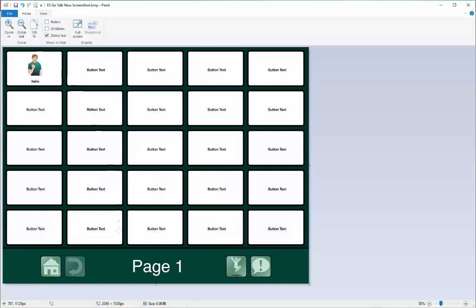I'm going to zoom out just so I'm sure I'm in the right place. So this is where we'd like to put our bump, right in the center of that. And that looks to be around 817. Well, when I measured earlier, it was 817 and 1041.